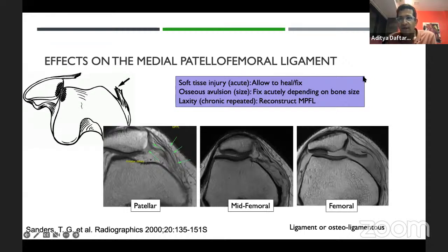So for follow-up of cartilage-related cases, which image should we ask for? Here the question for me to ask you is, what is the cartilage lesion that you're following? If you're following a focal chondral lesion, you have not done anything to it, and you just want to see is it getting bigger or smaller, then your routine proton density images are great.